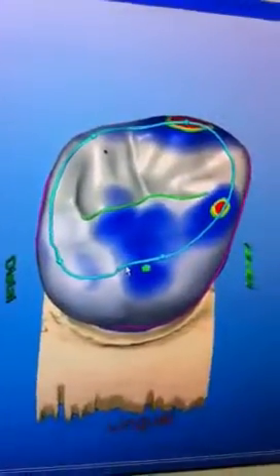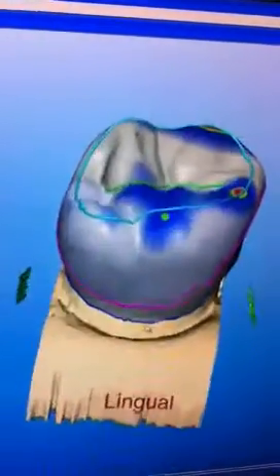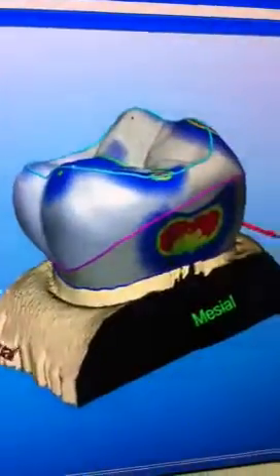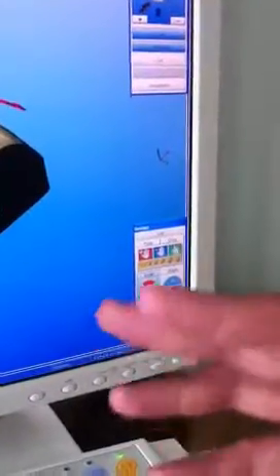Right. Got it. And if you want the actual top part, then you need to click on the line of cusp. So anything that is actually highlighted is what's going to be manipulated when you use the scale tool. You can't use the form tool with the scale tool. You have to use each tool individually. Okay. So that's how much.